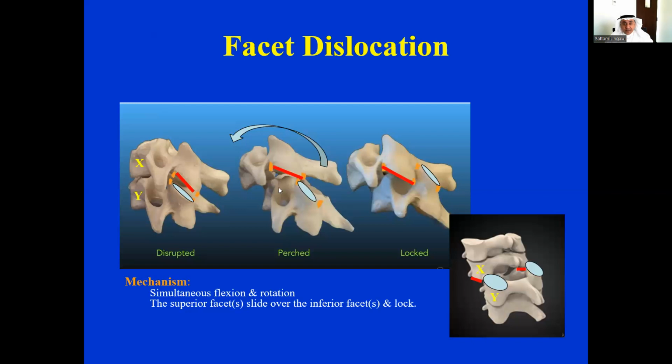So this is a stage of complete uncovering where the posterior edge of the articular surface of the facet above is pushed against the anterior edge of the articular surface of the facet below. With further flexion injury, the facet will fall in here anterior to the vertebra below and gets locked because it cannot go back to its location again without traction, and this is the complete locking.